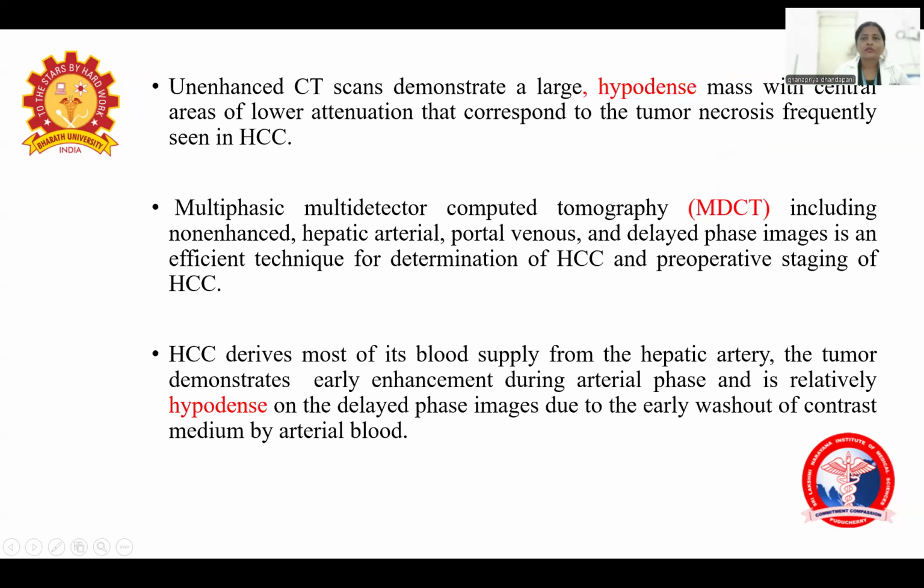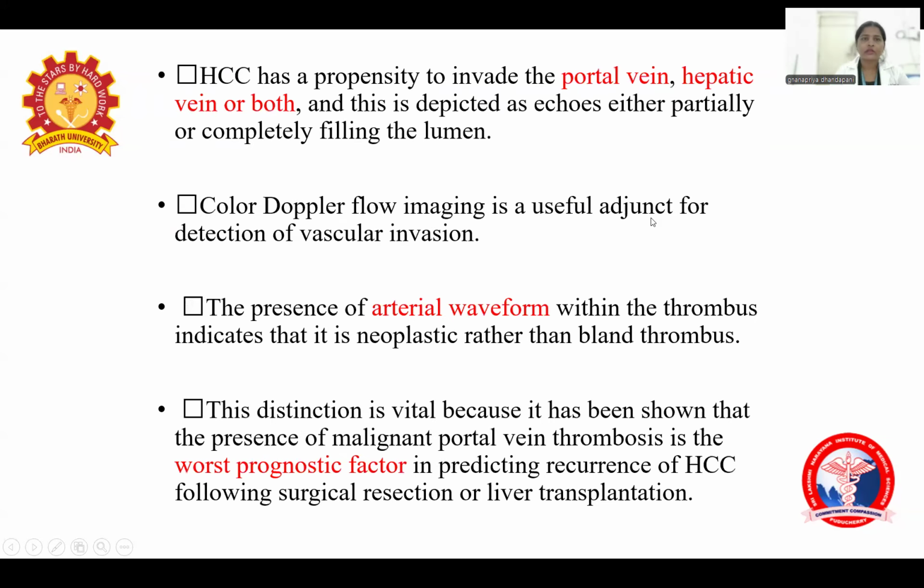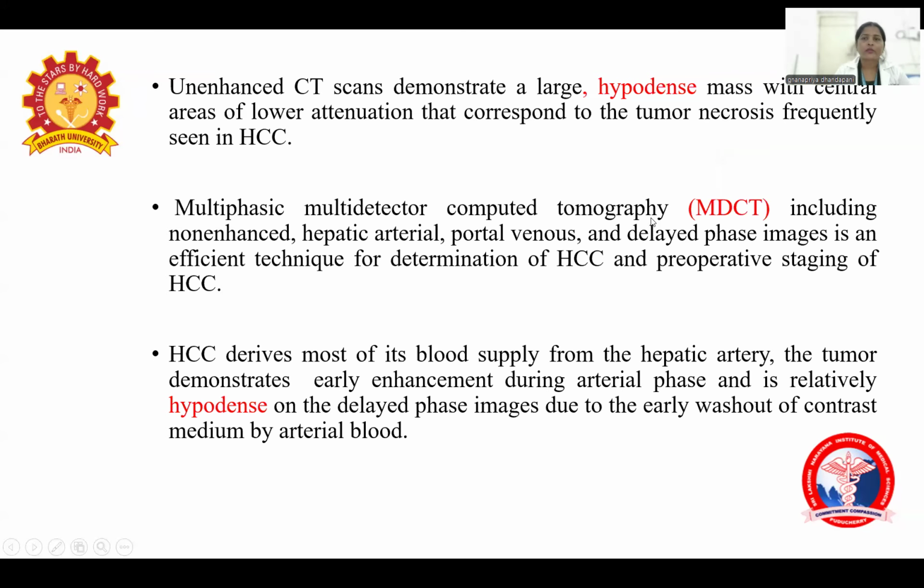So the multi-detector CT protocol includes first a plain or non-enhanced CT, then hepatic arterial, portal venous, and delayed phase images. It's an efficient technique, and it is also used for preoperative staging of HCCs.